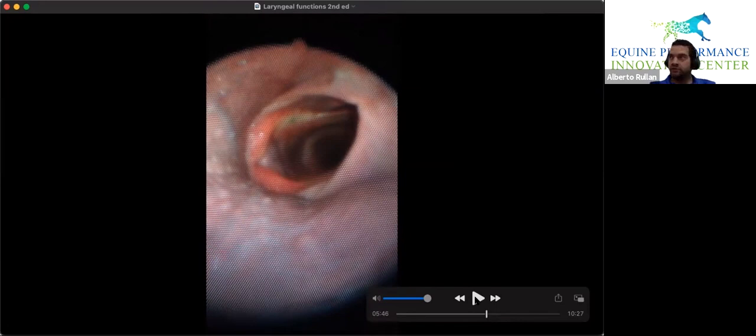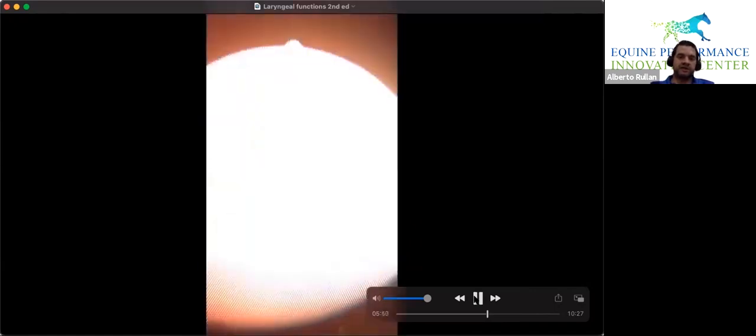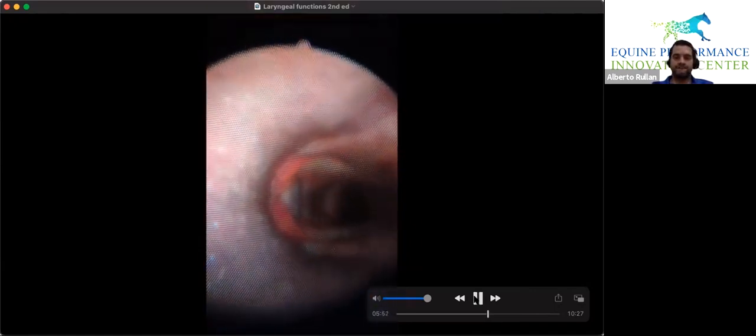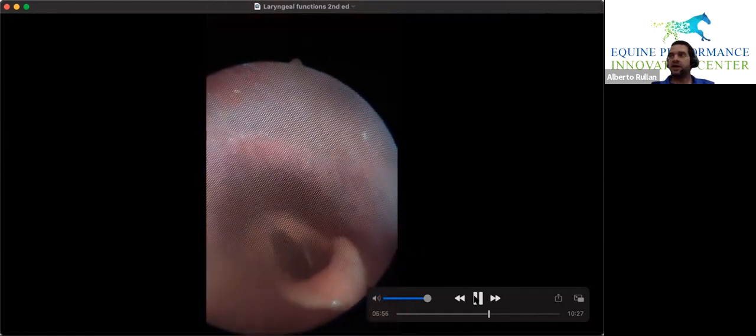Look at this throat. What's the diagnosis? Displacement of the soft palate. And what else? Trick question. Look, there's a little bit of food right here. So this one, there's a little bit of food over there. So sometimes these horses develop quite an infection because of that. Food goes up there. So I displace and replace.